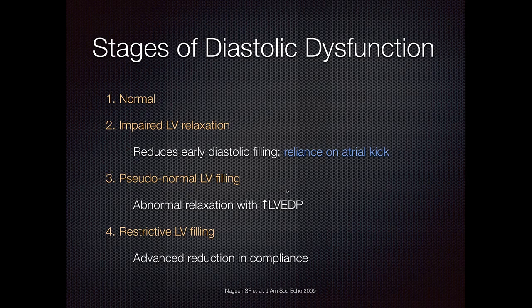Then as the ventricle end diastolic pressure starts to build up with all the filling, eventually even the atrial kick isn't contributing much. So you end up getting this pseudo-normal pattern again. And lastly, you get very advanced reduction in compliance, and you get the restrictive LV filling pattern, which is late stage diastolic dysfunction.